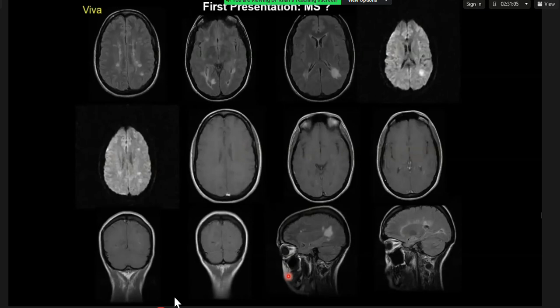Okay. So on the FLAIR sequence, I can see periventricular foci of high signal bilaterally. I can also see more confluent areas on the third image on the top row, which demonstrate restricted diffusion. Having a look at the sagittal images, that does appear to have involvement of the septocallosal area.